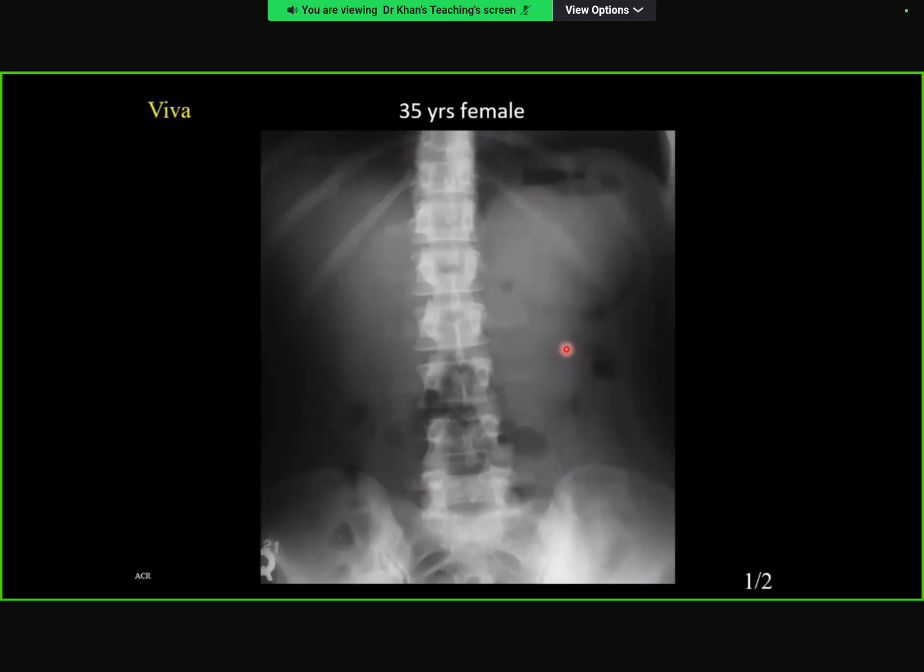It looks almost like a house. So it is very rounded, right? It is very rounded. In that location, it could be an adrenal gland mass. So now you are talking about what we call a differential, and your mind is absolutely working brilliantly, because now you have seen that this is kidney. Now the lesion is here.